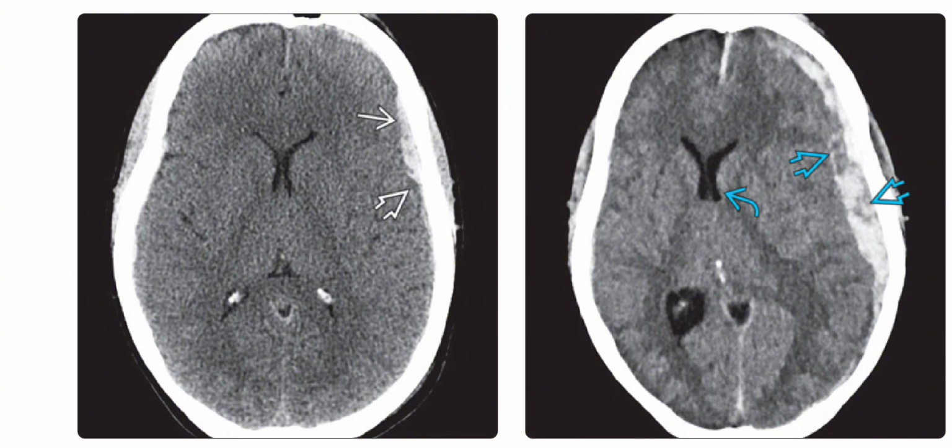The right image is the same patient, whose condition has deteriorated; this image was obtained 5 hours later. The acute subdural hematoma has expanded significantly, and there are multiple foci of hypodensity within the hematoma, indicating rapid bleeding. Subfalcine herniation of the lateral ventricles is also noted.